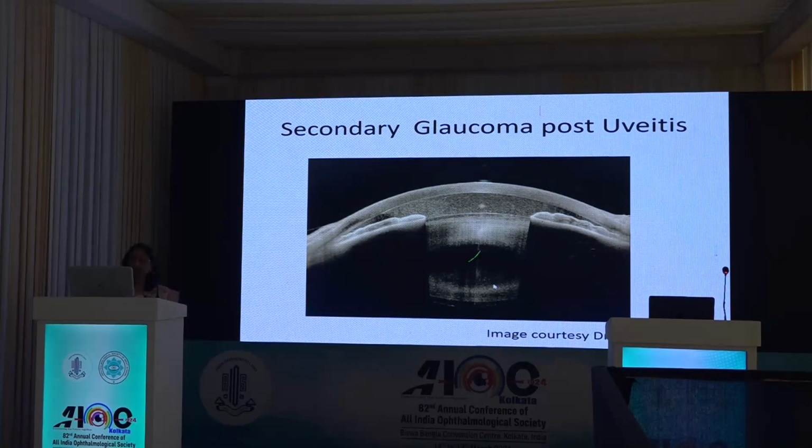Again, this is a picture taken on the Anterion, in which the patient had secondary glaucoma post-uveitis, and the inflammatory reaction was mixed, like AC cells plus pigment. You can visualize that very clearly, and we can monitor the response to the treatment also on AS-OCT.